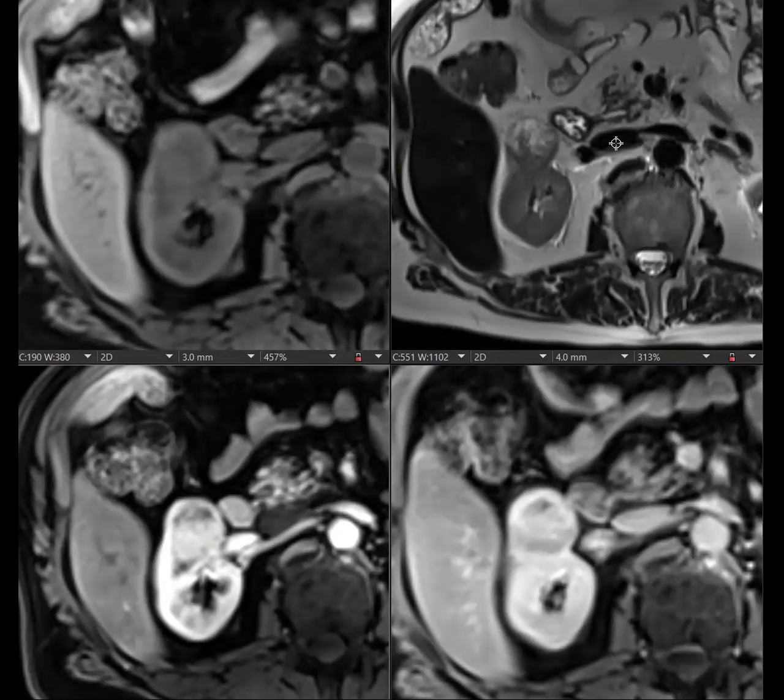Well, anyway, I thought the signal is supposed to be the most enhancing area, but maybe I'm doing it wrong. It's just that it has two different parts. But anyway, okay, so let's just say intensely enhancing. And then microscopic fat.